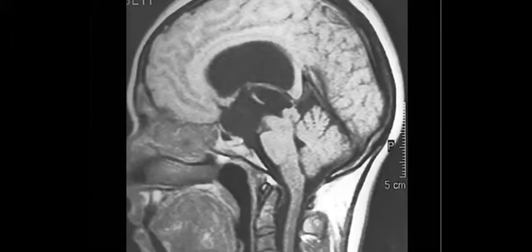From one picture, you don't just give the differential; you scroll the image if you have the stack. But what is common? If they show you a pediatric patient in the exam, and you have dilatation of the lateral and third ventricles, the most common would be aqueductal stenosis. Okay. Then go further if they ask you more and more. Okay.